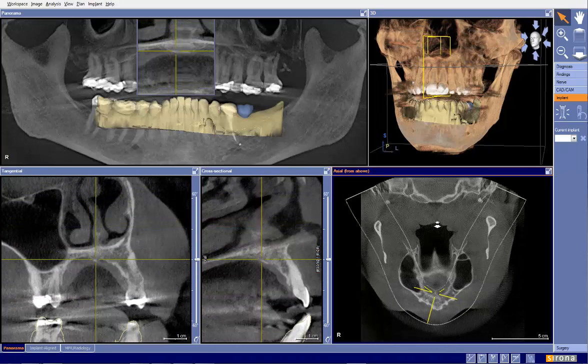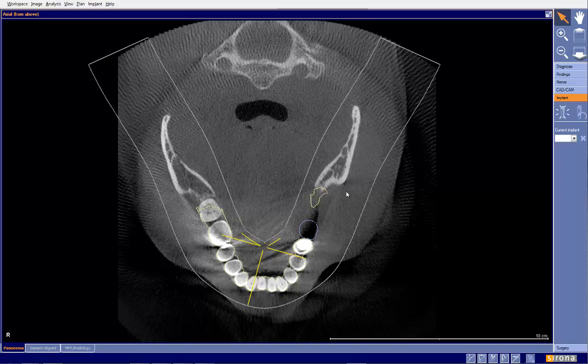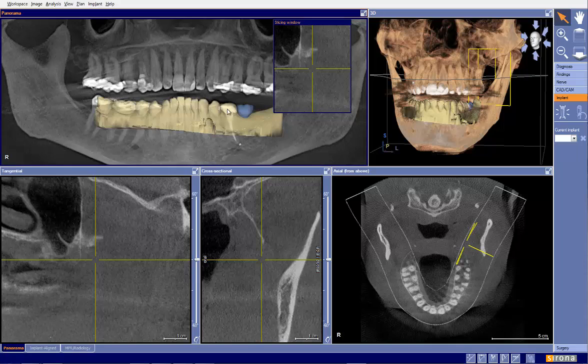And to do that, I'll come here to the axial view and I will start going down until I see the tops of the teeth. And what we can see here is this data is highly integrated around those natural teeth there. So it looks very good. And the good news is, again, to fabricate an OptiGuide, we need at least half to three-quarters of the arch. In this case, we have all the way back to the second molar, perfect situation.